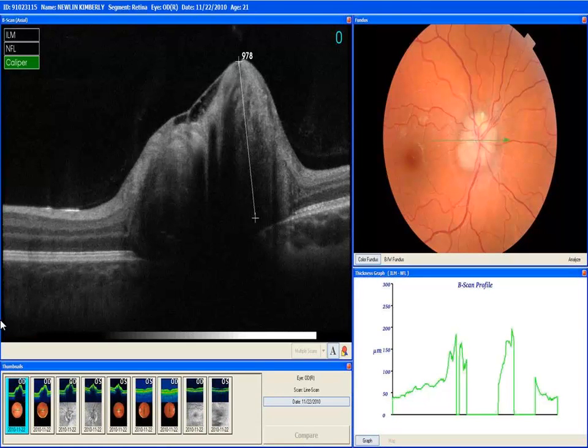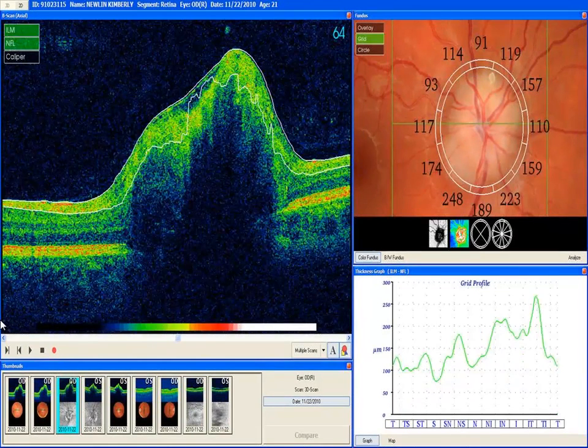What is helpful in the differential diagnosis, somewhere down here, is this. Okay, we're actually measuring the retinal nerve fiber layer thickness. First time tonight we're talking about that, but we can see the nerve fiber layer thickness below is clearly greater, 189 microns versus, say, 91 above.